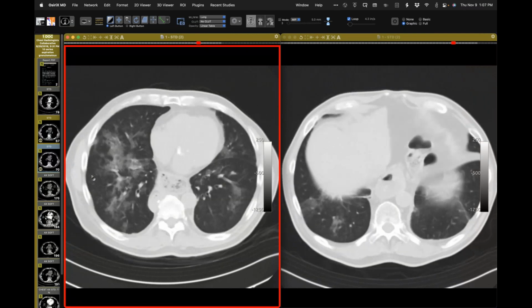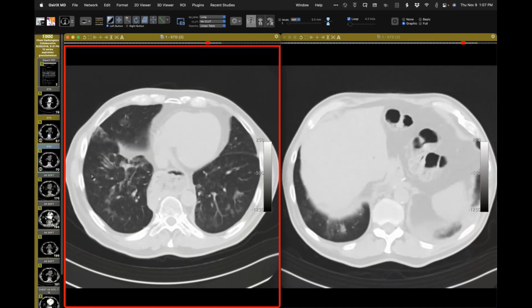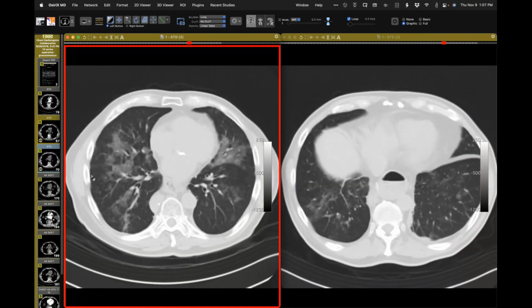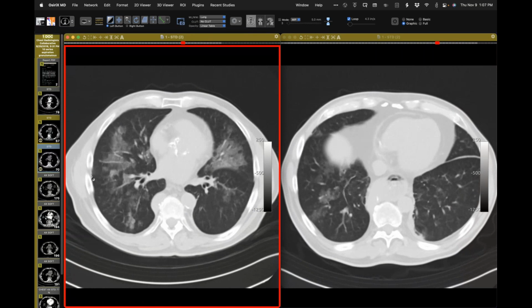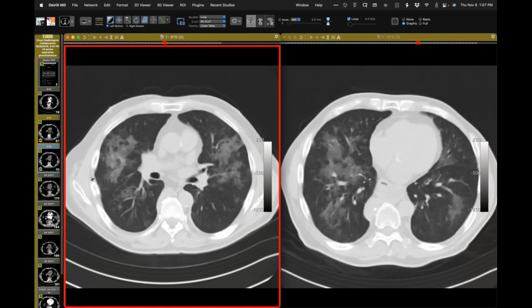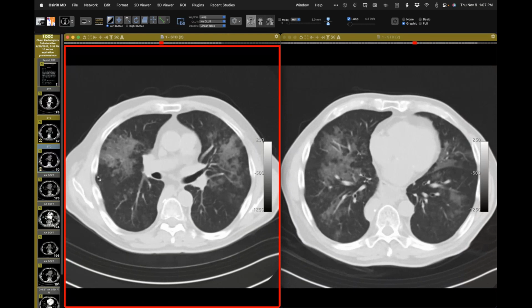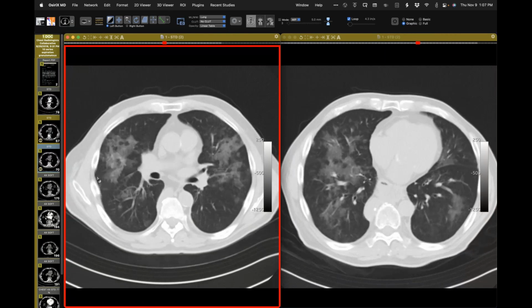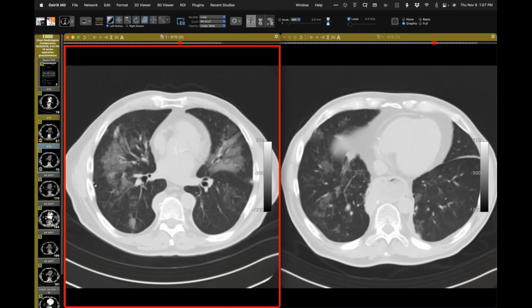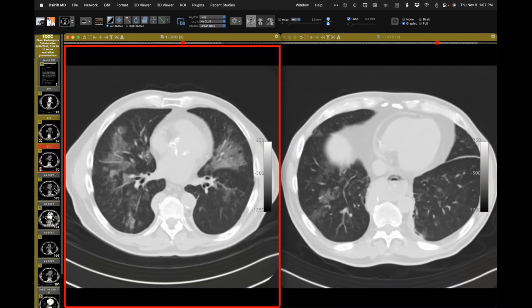a diagnosis that was strongly considered was alveolar proteinosis. And he had whole lung lavage, and I'll show you the path in a moment. But the findings on path were not really strongly supportive of the notion of pulmonary alveolar proteinosis. But that diagnosis persisted for quite some time. So let me go to 2021 here.